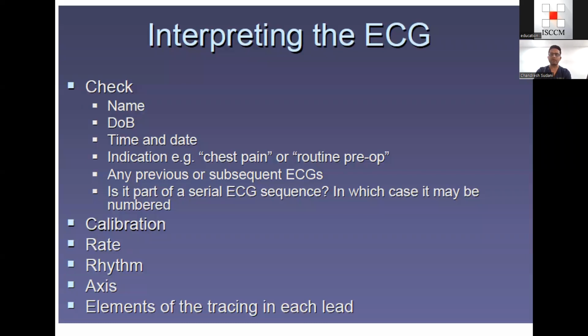Now, whenever you start interpreting the ECG, the first thing you need to do is check the labeling. Labeling can be different as per the hospital policy, but it should definitely contain the patient name. Date of birth is not mandatory, but if the patient's age is mentioned, it is good. Sometimes we also write with a pen, particularly if the ECG has been taken immediately after a PTCA, so this kind of small medical history sometimes will be visible on the ECG paper. That we have to remember.